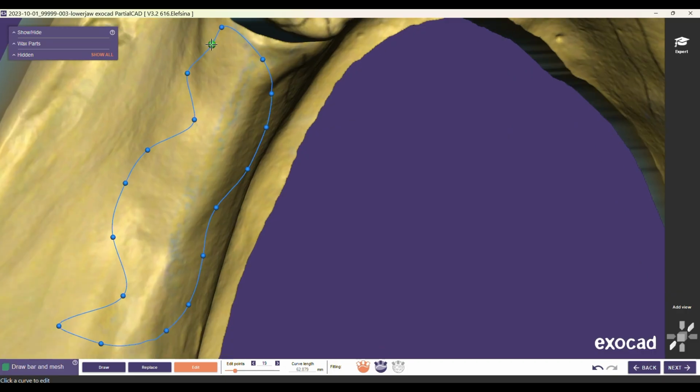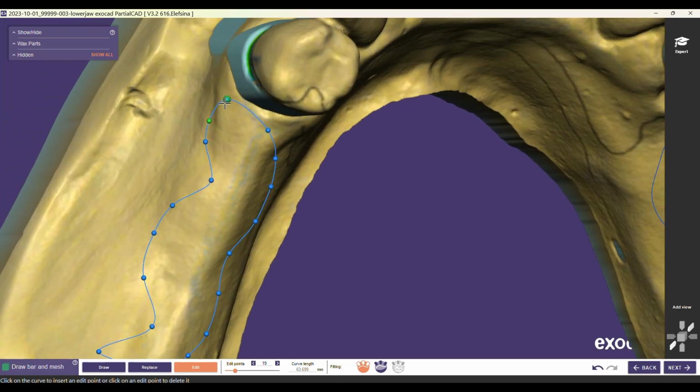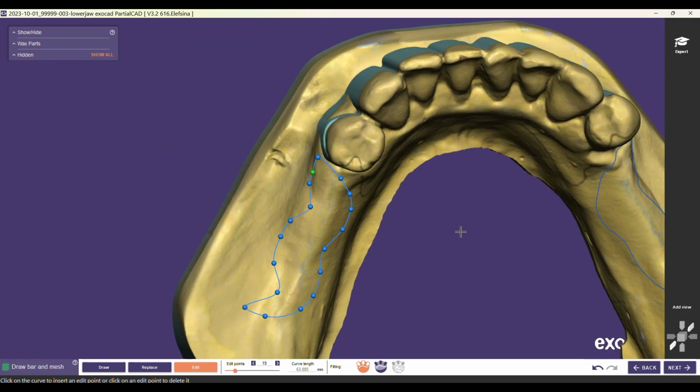I'm just going to speed run through the steps right now, and then I'll probably give you a fast forwarded way of how I finally refined my design as well, right? Don't want to waste too much time in perfecting it right now.